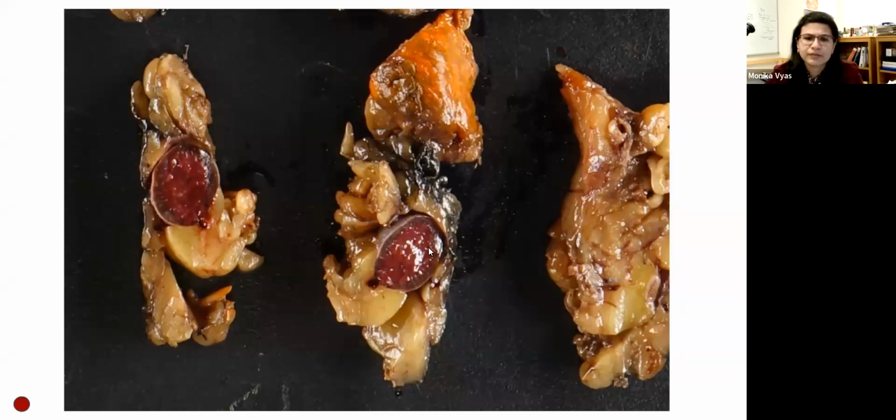And on resection specimen, you can see, this is another case, just an example of a nice gross example of a spleniole. Sometimes residents can mistake these for lymph nodes and put them in distal pancreatectomy specimens as lymph nodes, but the gross appearance is pretty characteristic: very hemorrhagic cut surface, and a very distinct capsule.